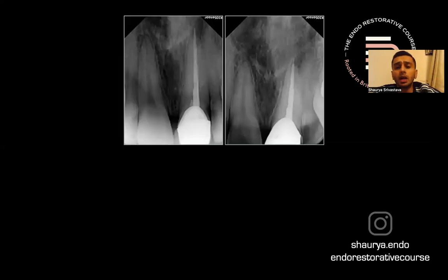All right. So this is taking you guys to radiology reports, which is what I see very often when someone refers a patient over to me. They'll send over the scan slices, they'll send across a radiology report as well. And I look at them and I see that there's a massive misconception, or rather, I would say it's a bit wrong the way they provide the reports to clinicians. Okay, so a colleague of mine sent these X-rays over to me, asking if I would retreat this and what would be my take on it, etc.